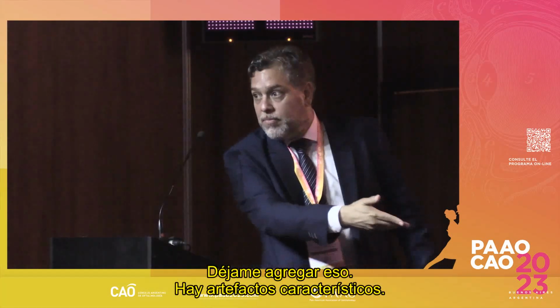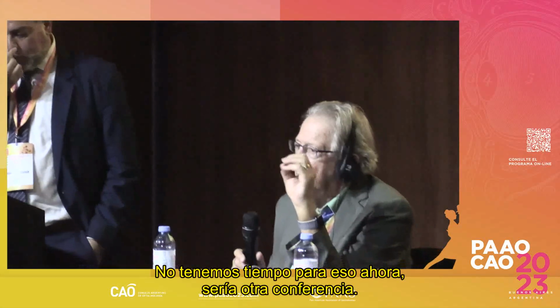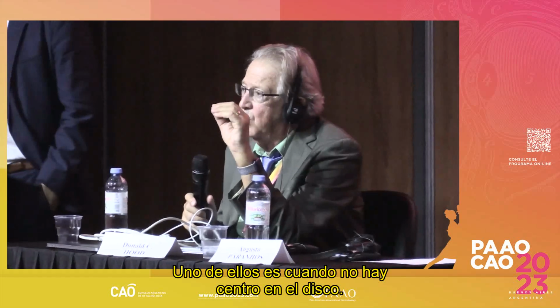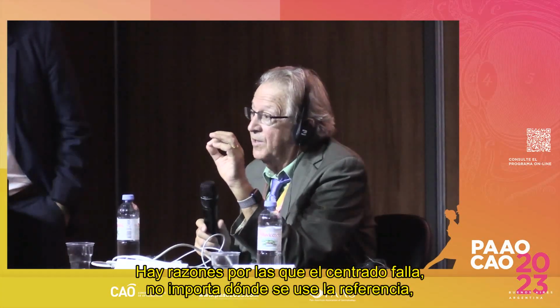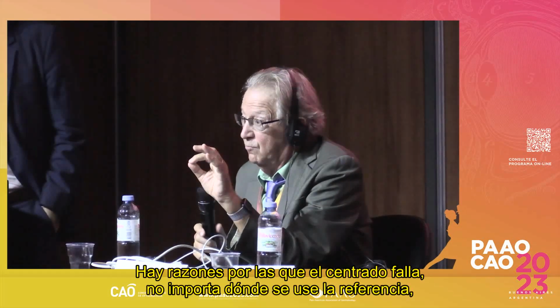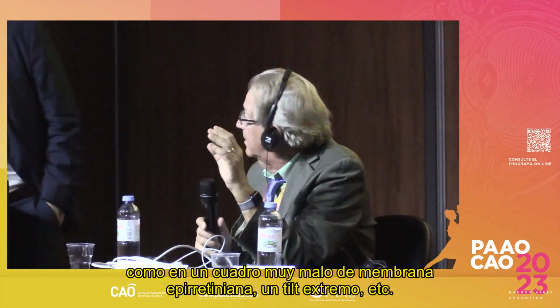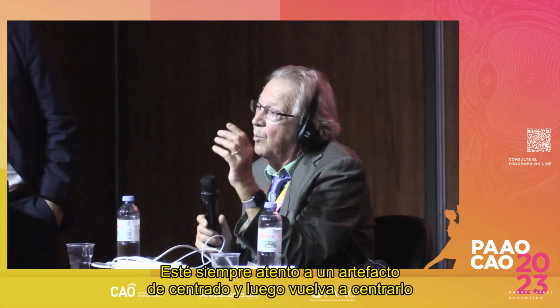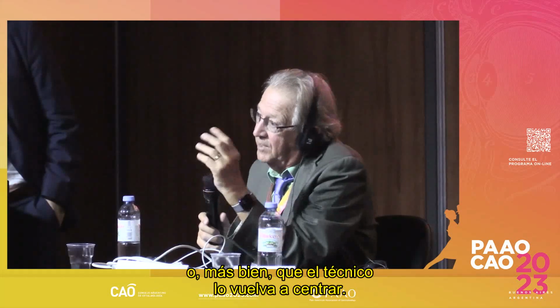Yeah, let me just add to that too. There are characteristic artifacts. We don't have time to go into them now, but that's a separate lecture. One is when you don't have a centering of the disc, so you can recenter that. There are other reasons why the centering will fail no matter where you use a reference, such as really bad epiretinal membranes and extreme tilt and so on. So you always want to be on the lookout for a centering artifact and then recenter, or have the technician recenter.